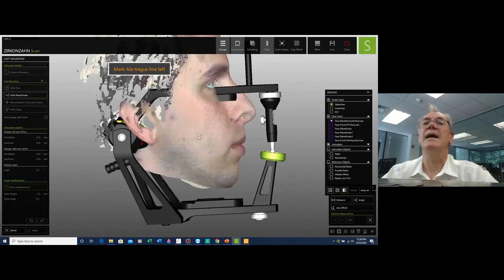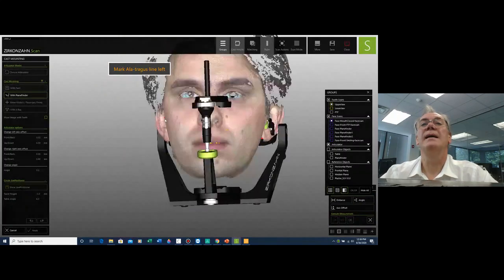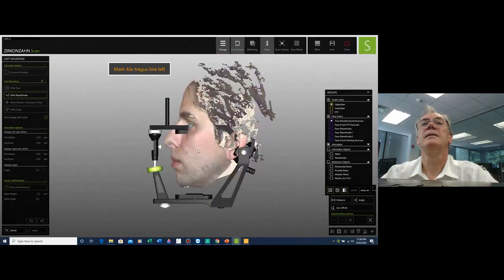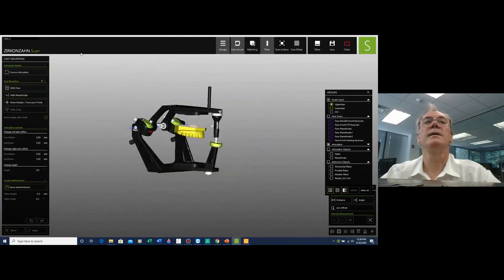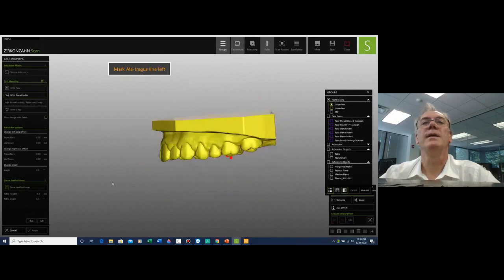We are going to use the actual face. By determining, I lost the point. Let me start over again. Plane finder, just let me do this quickly. I lost the point. I was distracted and it went forward. There you are. And now I'm going to bring in my face.